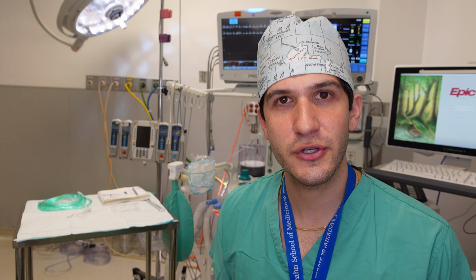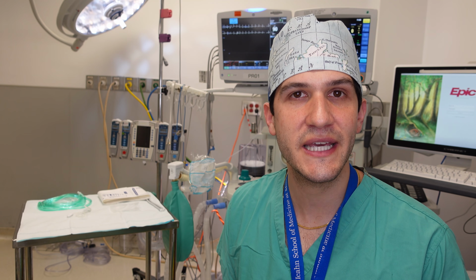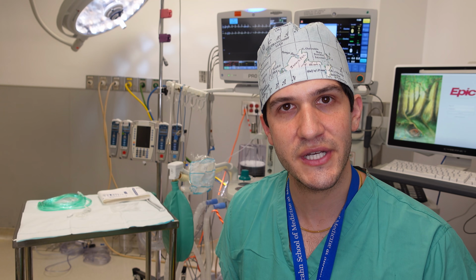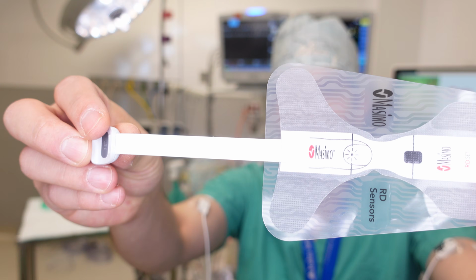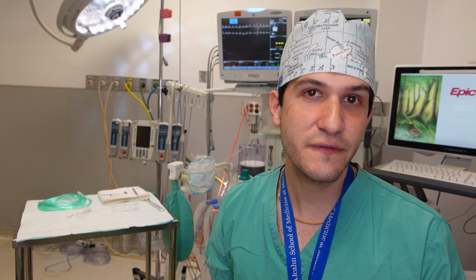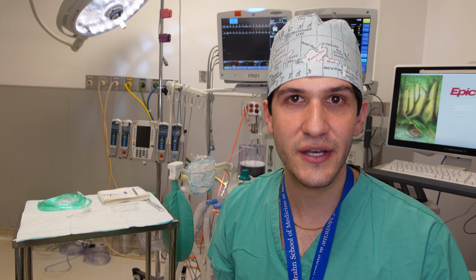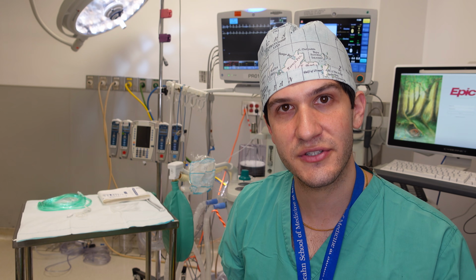The next monitor I want to show you is pulse oximetry, which essentially refers to how much oxygen is being carried in a patient's blood. There are a lot of different types of pulse oximeters, which are devices that measure oxygen saturation, and the one that I've got here today is a sticker that looks just like this. And this sticker will get put on a patient's finger typically, but there are devices that are made to go on a patient's ear or nostril or toe or any area where there is blood that's going through, and my machine is going to be able to capture oxygen saturation.